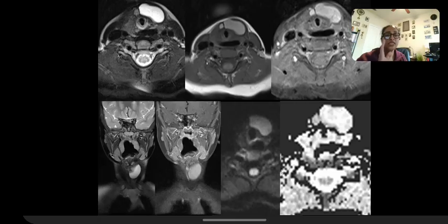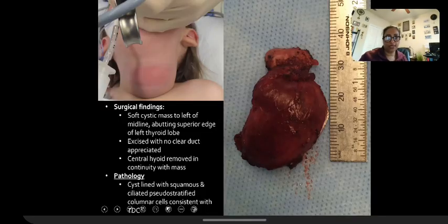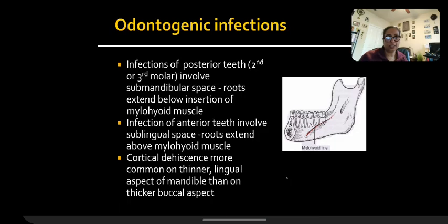And as you all know, even though the teaching is that the thyroglossal duct is midline, when they're infrahyoid, they can be off midline. So remember that. I know a lot of trainees, when I train them, think it has to be midline. But remember that below the hyoid, the thyroglossal ducts can be off midline. So be mindful of that fact. Okay, let's move to the next. This patient was operated and this turned out to be a thyroglossal duct cyst.